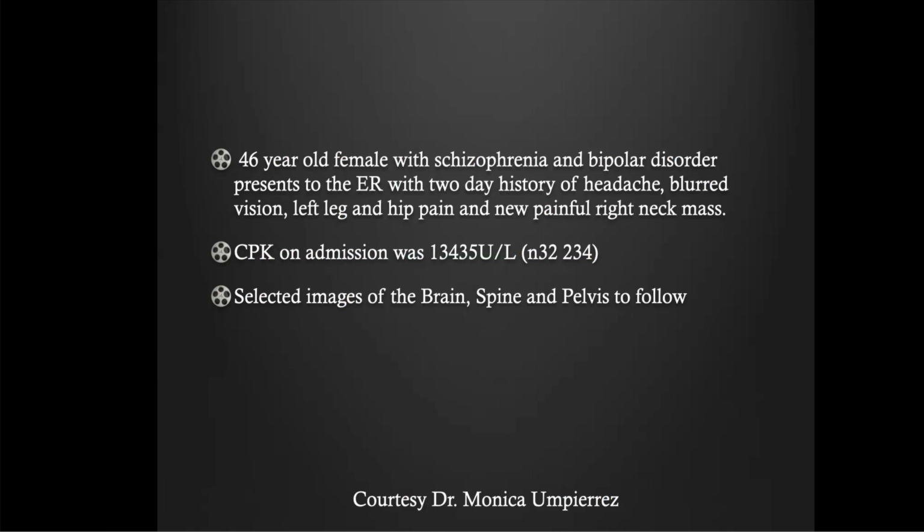Okay, Robert. All right, we have a 46-year-old female with schizophrenia and bipolar disorder presenting to the ER with a 2-day history of headache, blurred vision, left leg and hip pain, and new painful right neck mass. CPK was very elevated on admission, and we have some selected images of the brain, spine, and pelvis.